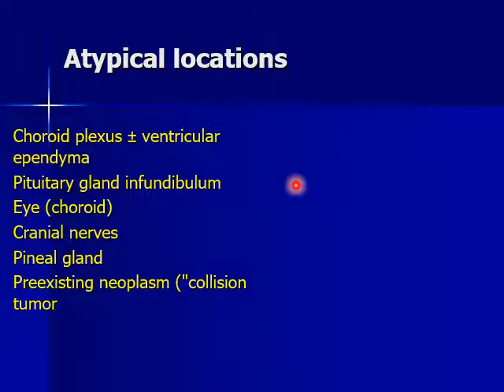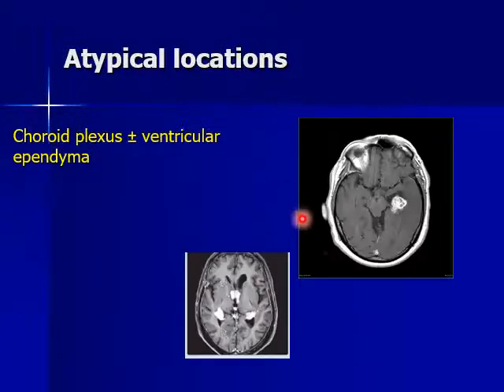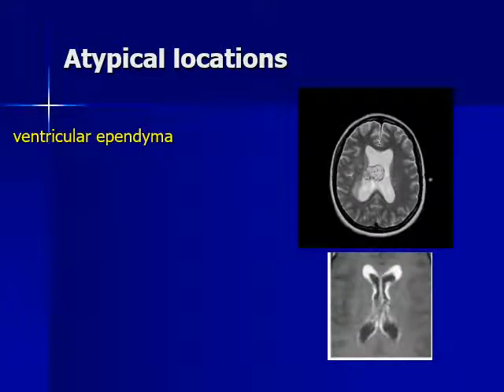Metastasis also can occur in a very atypical example. It can affect the ependyma or the choroid plexus. It can infiltrate the ependyma. And you remember this appearance? Subependymal lesion? Yes, we can see it in lymphoma and glioblastoma multiforme, and this is the third entity, metastasis. Okay?